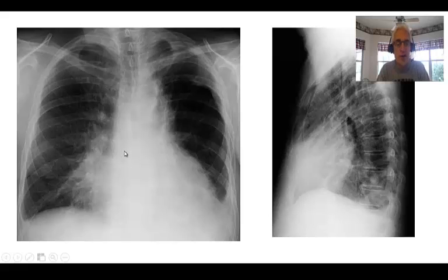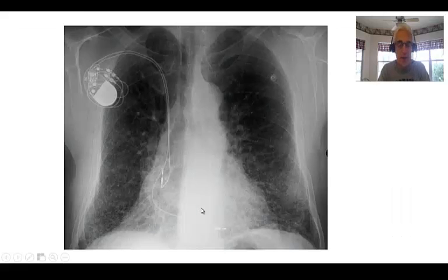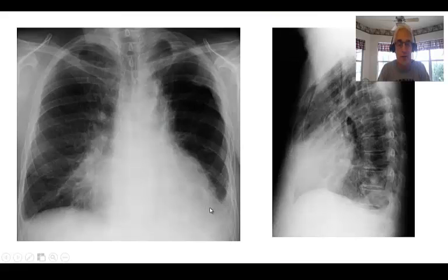The cardiac shadow is a little fuzzy on both sides. Diaphragm, certainly we can't find it on the left. And if you look in those angles, the angles are gone. There's an effusion on the left, an effusion on the right side also. There's no free air, gastric bubble you can't see. The hilum is somewhat obscured. Look at that interstitium. Big markings, infiltrate here.